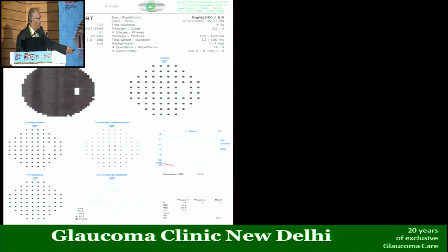So this is an example, the last example. One of our patients: at every meeting you go to, they say, patients who have ocular hypertension, do a baseline, call them in 6 months to a year's time. So this is what I did. I called a patient with ocular hypertension after 6 months. She came after 1 year, and this is what the field printout was like when the fields were done.